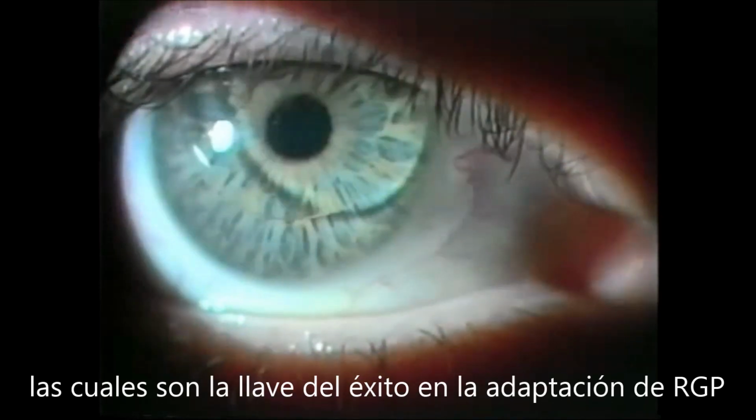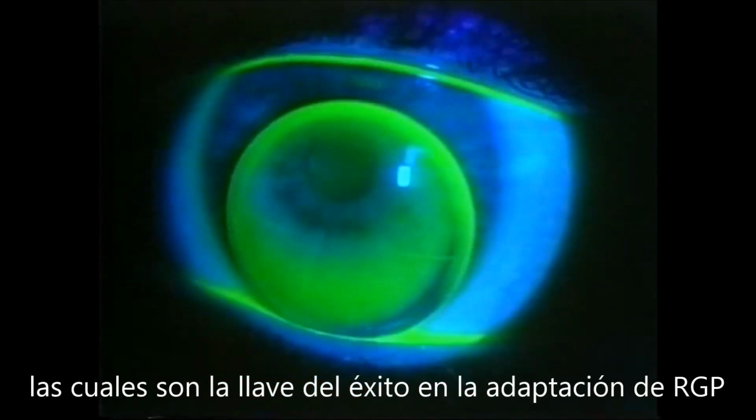They are the essential keys to successful fitting and management of rigid gas permeable contact lens patients.